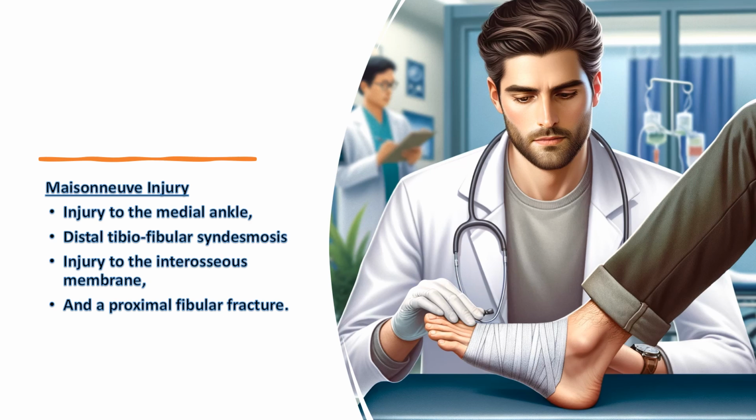An AP radiograph of the leg will demonstrate the proximal fibular shaft fracture. Clinically, patients may have ankle pain and instability, often misdiagnosed as a simple ankle sprain. They also often have proximal fibula tenderness. Other physical exam findings include tenderness over the anterior tibiofibular ligament, a positive squeeze test, and pain with external rotation. This injury requires a high index of suspicion.